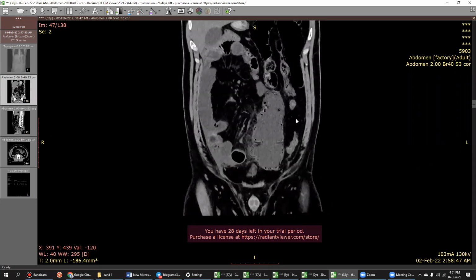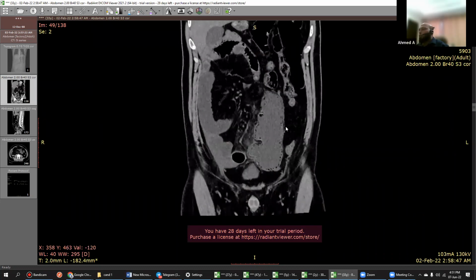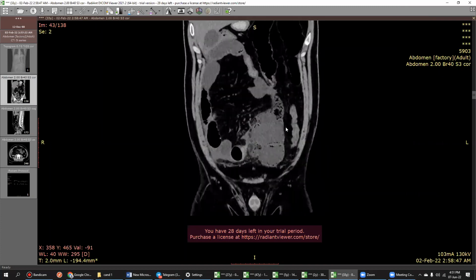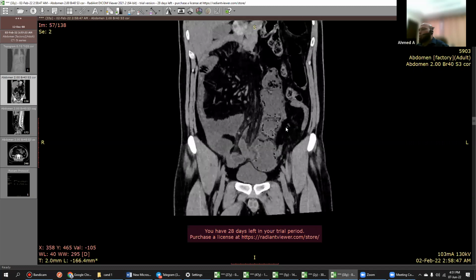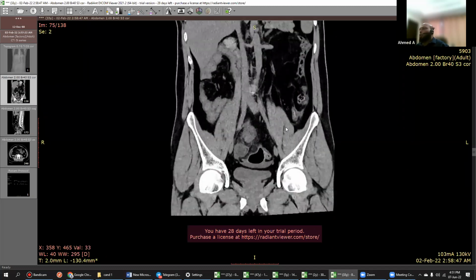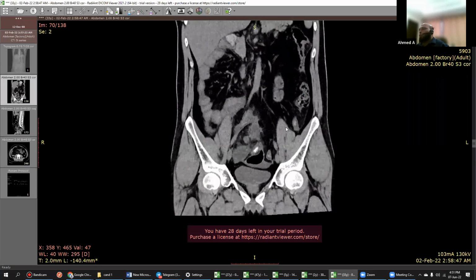However, what was the calcification thing then, if it is a lymphoma or anything? I'm looking. Sorry, I do not have the contrast for this study, but what is that calcification thing? Okay, I'll help you. Can you trace the cecum for me?